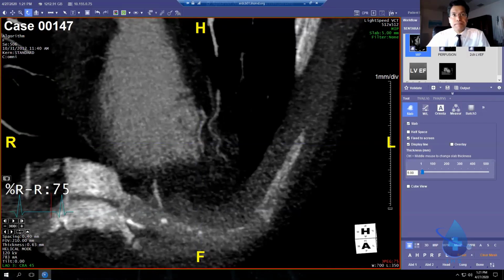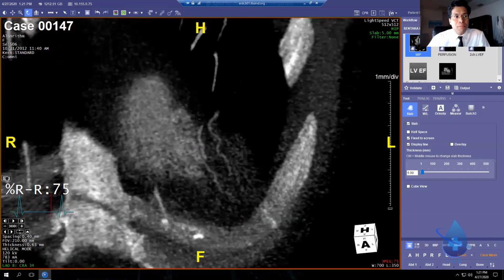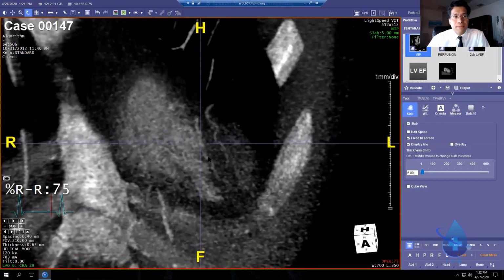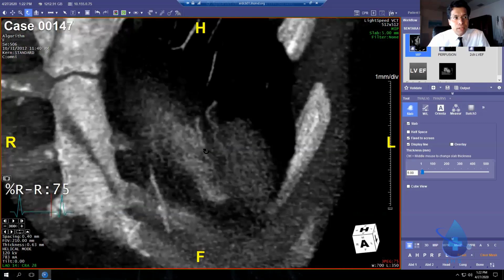When we're in the cath lab, what do you do with your image intensifier when you have a patient on the table? You move the camera 90 degrees to one corner to RAO and then back. And then you move the camera 90 degrees to the other corner and back. Why do we do that in the cath lab? So that we don't miss eccentric stenoses. And that's the same concept here. Because while this looks like a normal segment, there could be a stenosis that's out of plane. And the only way you're going to find it is by taking this and moving it like an II 90 degrees back and forth.